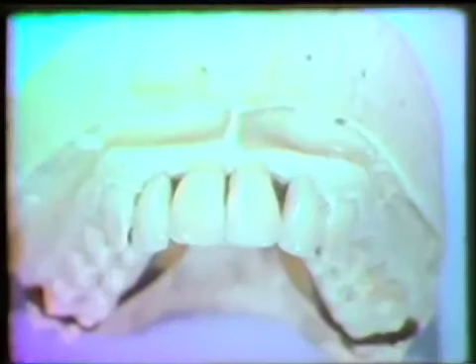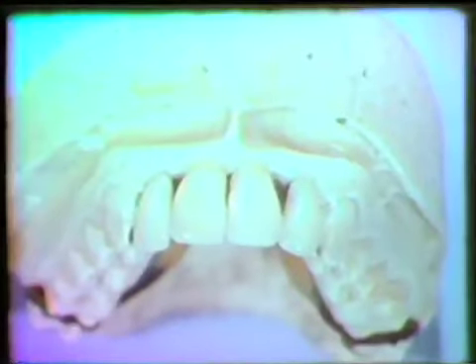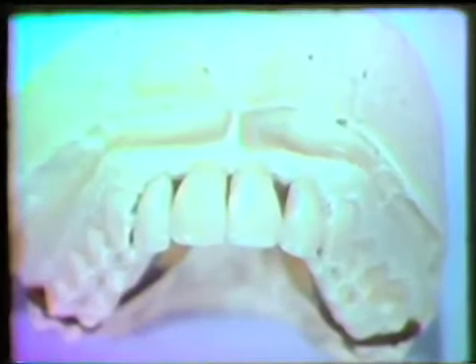The nature of the anterior base is determined by the degree of horizontal and vertical overlap of the anterior teeth. When the vertical overlap is severe and there is danger of breaking the anterior base, then an all-cast base should be selected. When this is done, the teeth must be set by the dentist and an index sent along to the laboratory so that the teeth can be replaced in position as determined by the dentist.